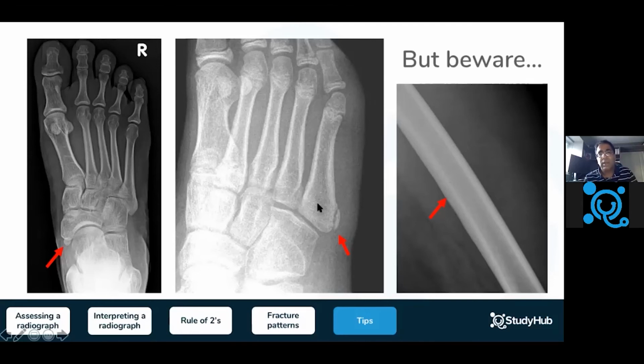Okay, so just going back to some important principles, because when you see these radiographs, first and foremost, try and correlate the history that's provided. So for example, if someone says to you, I've had a fall, my hip is hurting and it's the right side, focus on that area first. Then try and trace the margins of the bones that you are reviewing on the radiograph. And if you see any sudden angulation or any small spikes which shouldn't be there, then the chances are you are dealing with a fracture at that site.